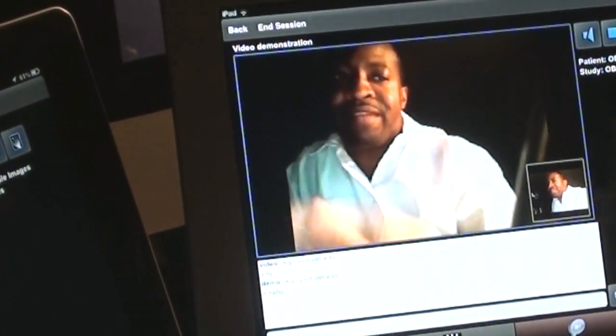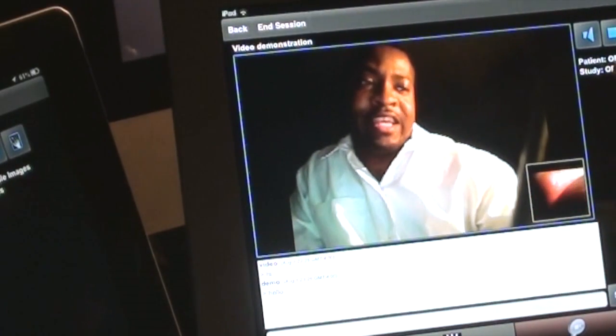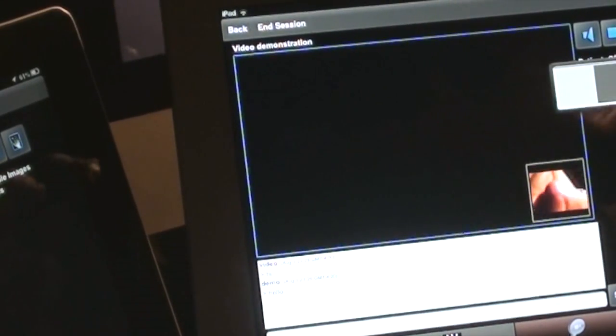Now let's collaborate, and we could have a video chat, and the name of the actual study selected is on the right hand side here. We have a number of icons. You could conference with multiple users, select them, what user you want to face or have a face-to-face conversation with. You can pause the video.